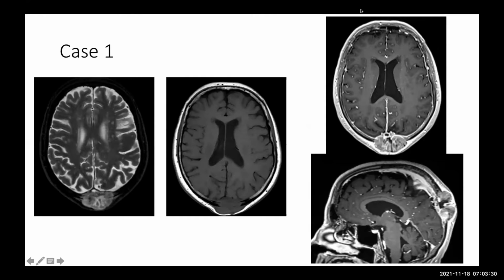So it looks like an extraaxial mass at the superior sagittal sinus in the midline. It looks to be heterogeneously enhancing, of mixed density, and seems to be, I would say, based in the bone, maybe in the dura.